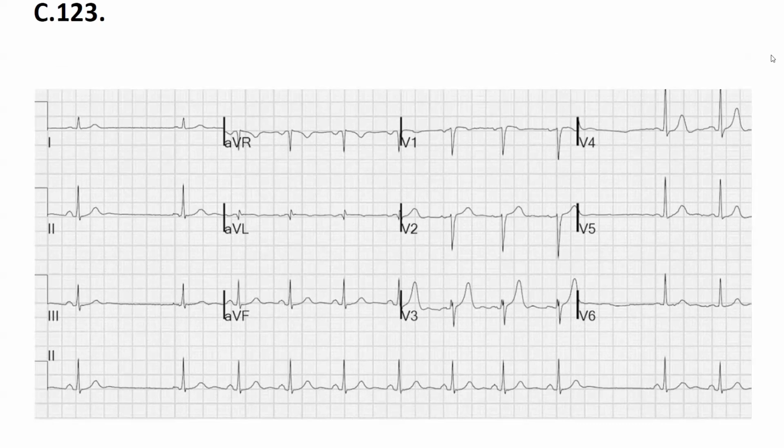So first, the rhythm looks arrhythmic. Can you hear me? Yes, I hear you. Good, go on. So it's arrhythmic. To calculate the rate, we can calculate the number of QRS complexes in 1 minute. In 1 minute you cannot calculate it, but you can calculate with 6 seconds, for example. Around 70. That's fine.